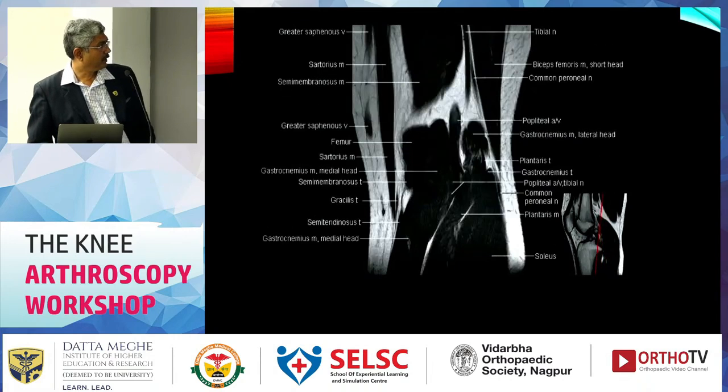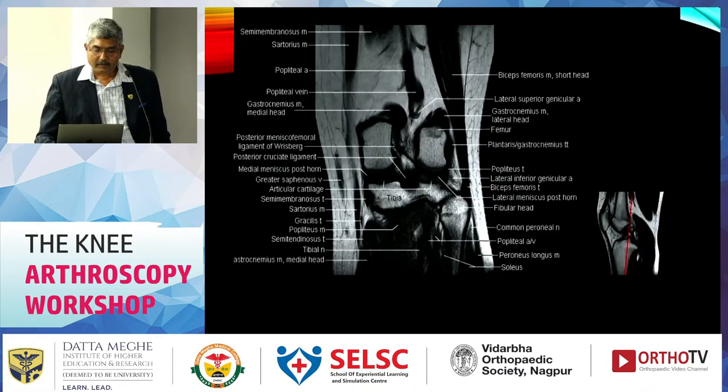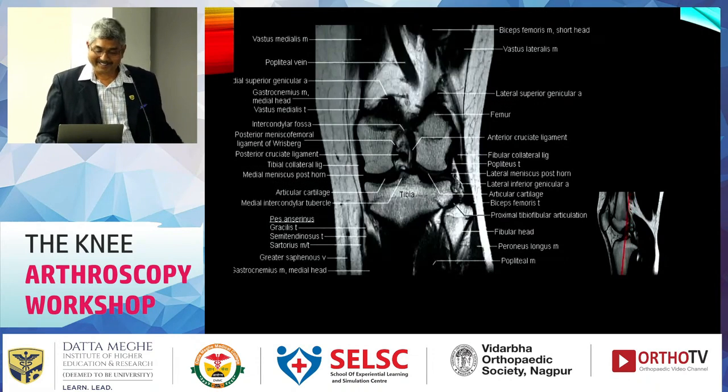So AI is actually coming in radiology very soon. It started working here automatically. Even without touching, everything is coming like that only. Anyway, it's great.